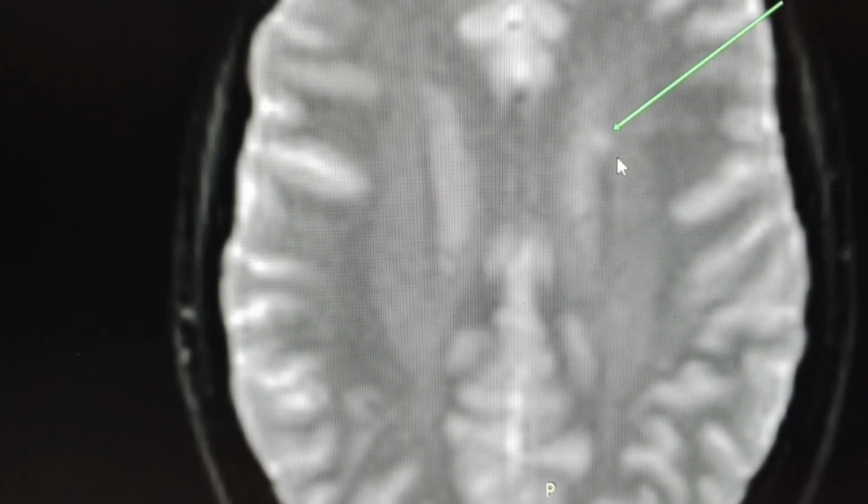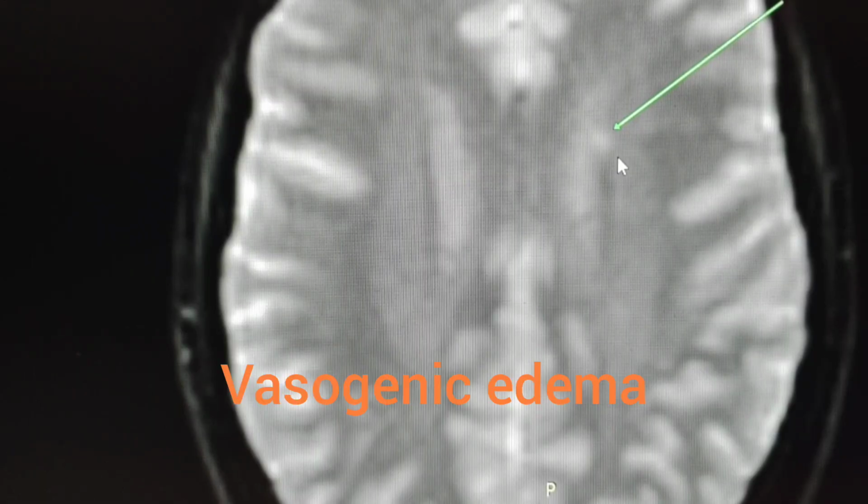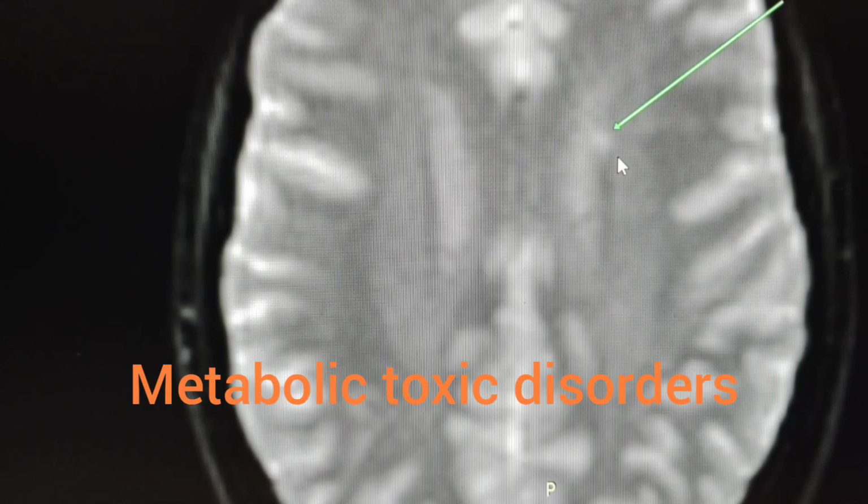Okay, the first we can think of, for example, is a vasogenic edema. For example, fluid leaking into the extracellular space due to inflammation, tumor, or ischemia. Another underlying cause would be certain metabolic toxic disorders like extrapontine myelinolysis or mitochondrial encephalopathy.